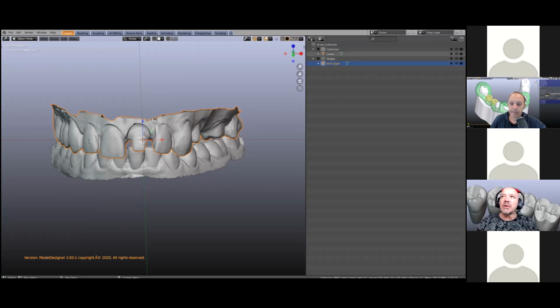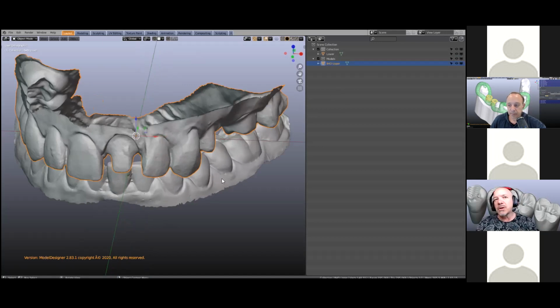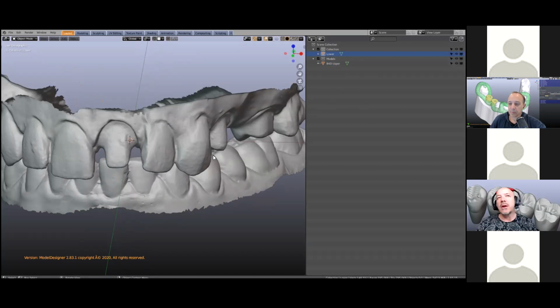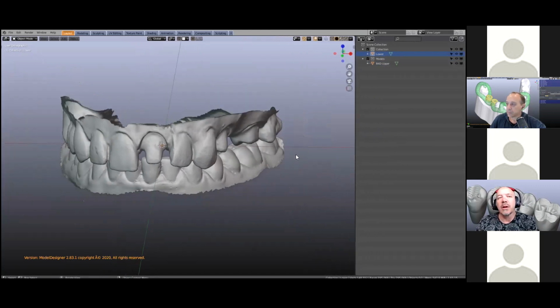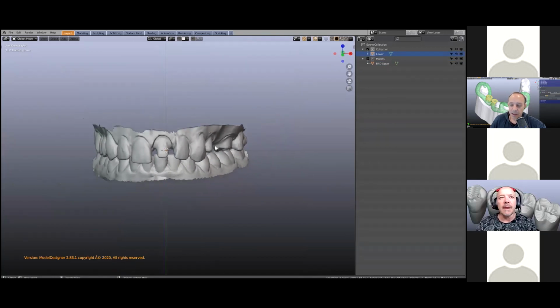So what I'm going to do is, oh yeah, one more thing. If you're working with a module and you cannot select something, it won't select. That's because this little one has been disabled. So if you disable these, you can't click on them. And that's a good thing, because sometimes you don't want to click on something because of a safety feature. You don't want to move a model, so that's quite important to know. Especially with implant components, as a safety precaution, you would have those locked.